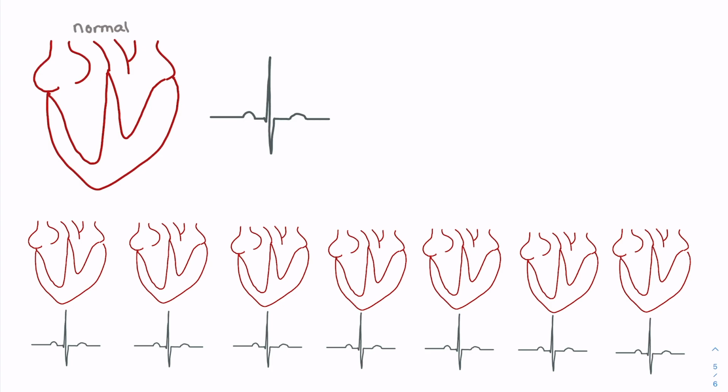So we'll start by taking a look at the isoelectric baseline. The isoelectric baseline of our ECG is representative of a net flow of 0 millivolts. So what that means is that when we're looking at the flow of electricity through the myocardium or the heart tissues, we're seeing a net flow of 0. So either the heart is at rest or, for the forces or electricity being moved through the heart, we see a net flow of 0. There's enough opposing force that we don't actually see flow in one direction versus the other.